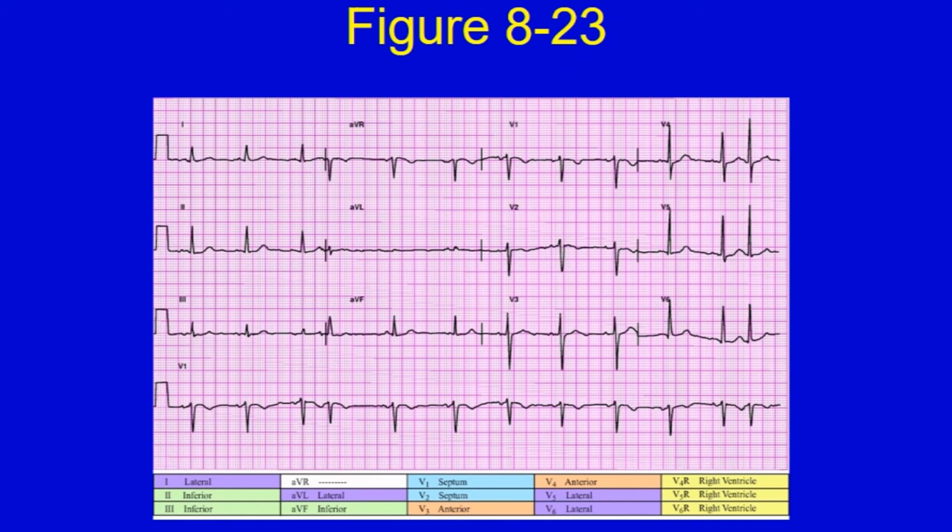The easiest way to look at that one's down here. What do you think? Have they got clear P waves? Are there some clear P waves? Yeah, there's some clear P waves. So here's P wave, here's P wave, here's P wave, here's P wave.